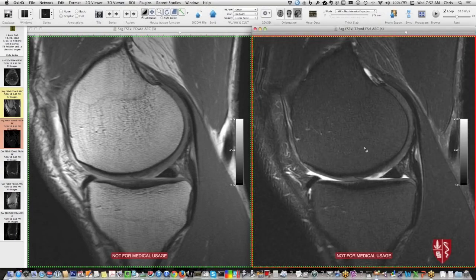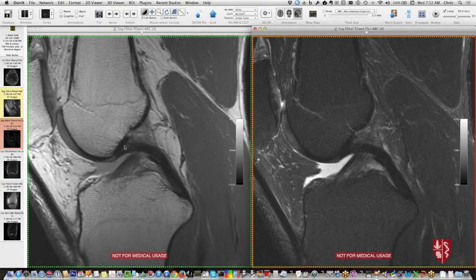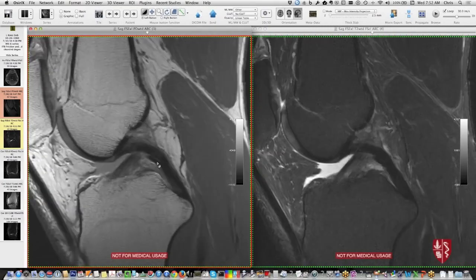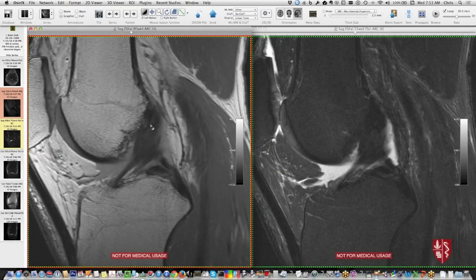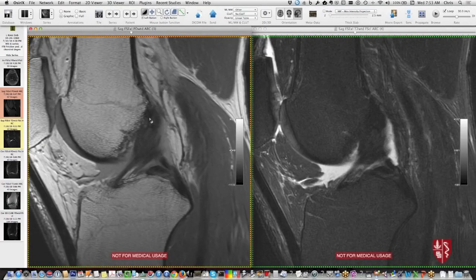Okay, so that takes care of the medial compartment, and then you can start going into the intercondylar notch here. We encounter this big, thick, black ligament. That's the posterior cruciate ligament, right? And you have some of these meniscofemoral ligaments that cruise by. Here's the anterior cruciate ligament. We know that when we get to the femoral attachment site, that should be lateral because it's really flat right along the lateral femoral condyle. So if I go sweeping laterally, here's lateral, and here's that ACL coming off.